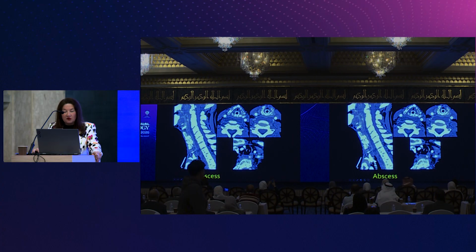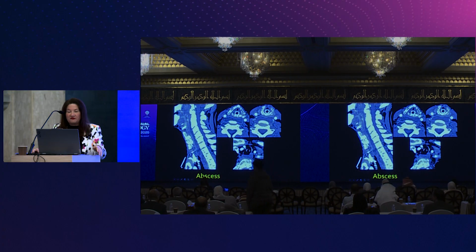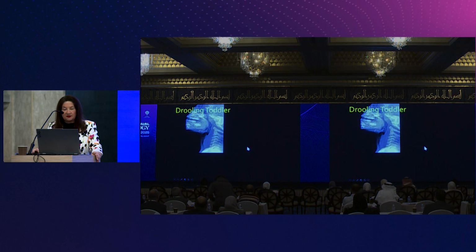And don't forget to follow this all the way down into the mediastinum. You've got an abscess there. You've got to follow the inferior extent. And here again, a nice thing sitting in front of the vertebra and behind the constrictors, a nice demonstration.